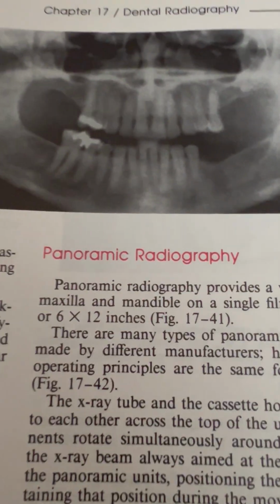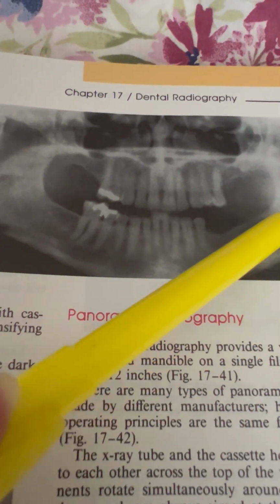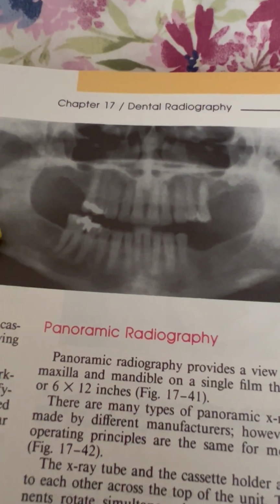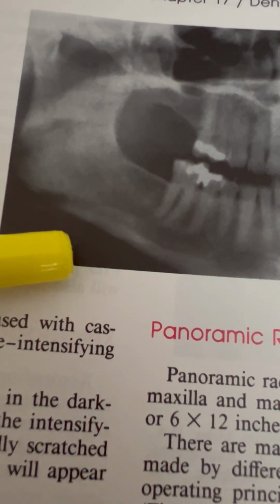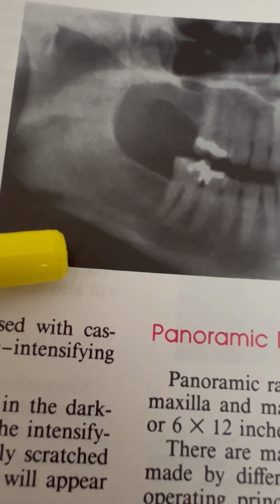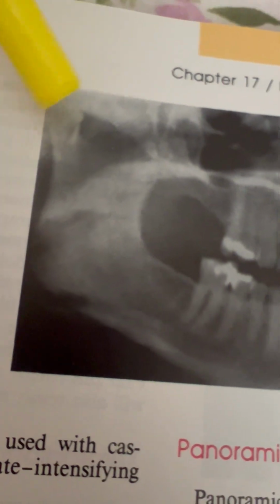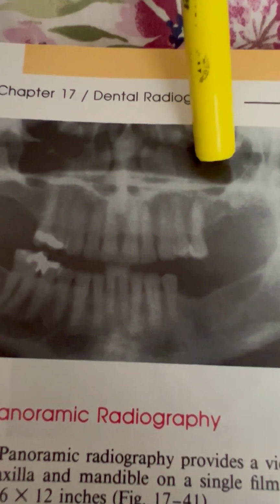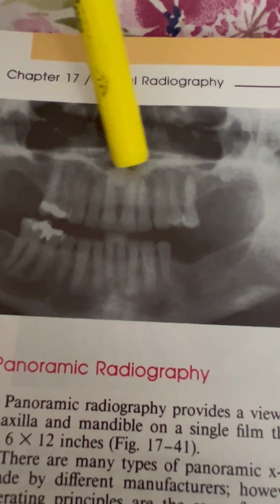So this area here, how you can tell the difference is look at that smile line. See a smile line here. So this is the lower jawbone. The way you can tell the lower jawbone, if there wasn't any teeth, is actually if I go in a bit closer, it's more like a cobweb consistency, the bone, as opposed to the upper one. Do you see all these little gray shadows in between? Those are the sinuses. So that's where your nose would be, if there was flesh on this thing. Okay? So this is the upper, and this here would be your sinus.